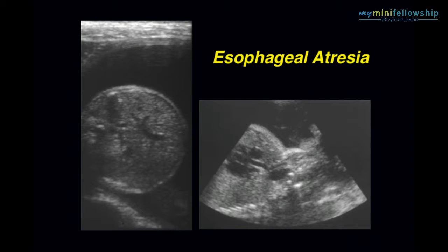When I'm actually diagnosing esophageal atresia, I realize that overwhelmingly that is a presumptive diagnosis. Polyhydramnios and an empty stomach, it's a presumptive diagnosis. And the only way to make the diagnosis with certainty, at least that I'm aware of, is to look up into the neck and the thorax, looking for the dilated esophageal pouch.